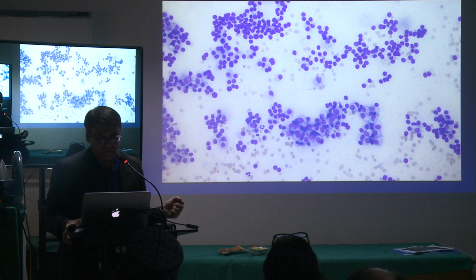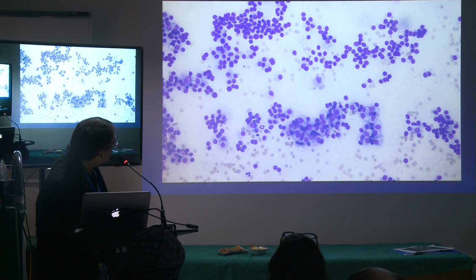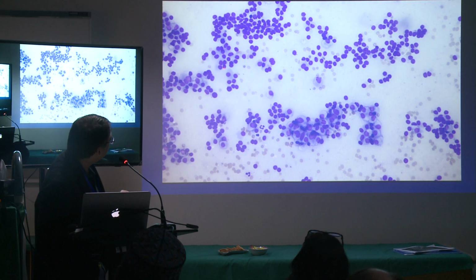So here, a little bit closer view. Actually, let me point to some of those cells. What do you see here? Do you see all these nuclei, right? Do you see any difference here? What do you see?